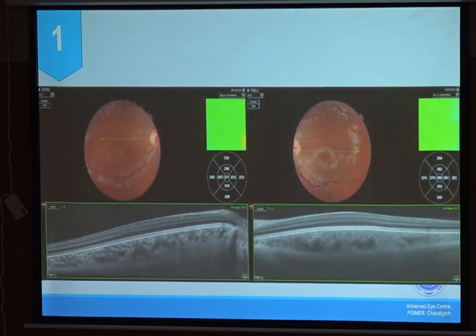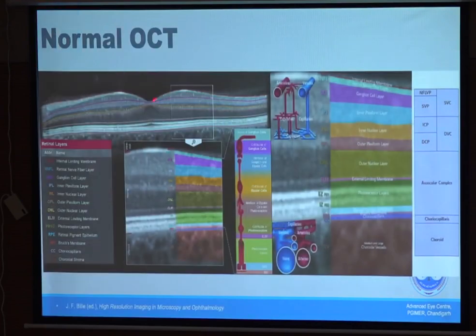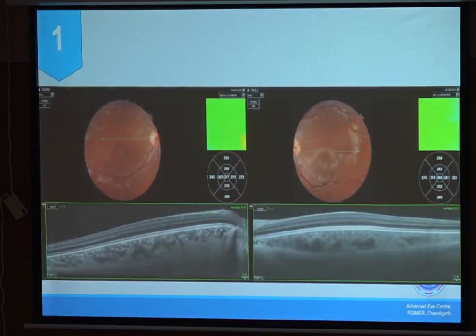So coming on to abnormal OCTs, this is something very striking. We are very used to seeing this very nice foveal dip, and that we kind of concentrate most on. When you get this type of OCT in a young child, what do you think? So you see this scan is passing right where the fovea should have been.